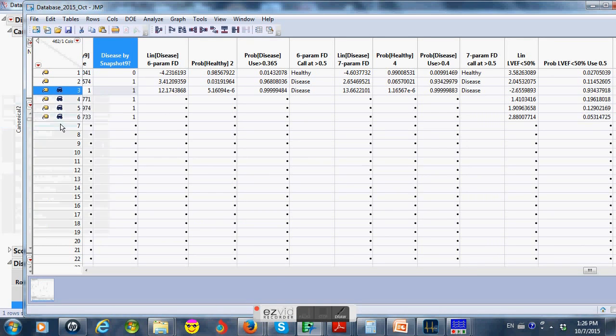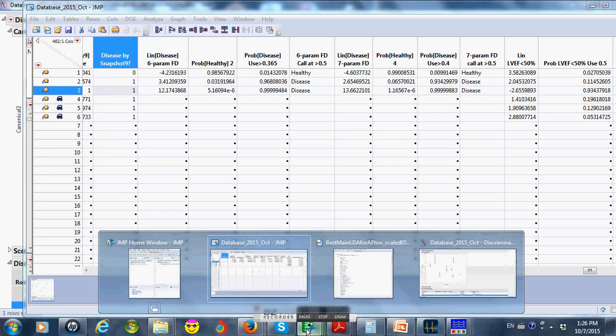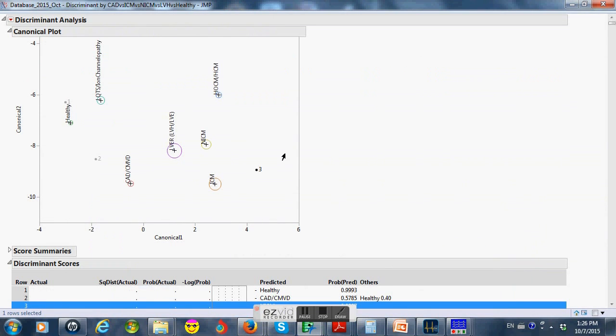Positive disease scores as well by the logistic. Remember, both the snapshot score and the full disclosure score were positive. Now let's look at number 3. And remember, this was the patient that had slightly more abnormalities, some T-wave changes, but still a non-specifically abnormal ECG. And we can see that this person, this man, ends up out in the cardiomyopathy territory.